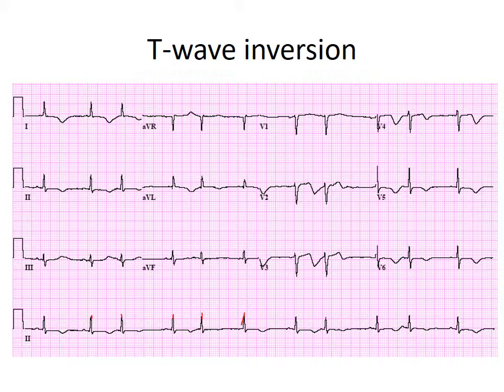All right. That being said, let's look for P waves. Do you really see P waves in here? Well, maybe at this very first QRS, on the rhythm strip at the bottom, you might have a P wave. Maybe that second one. The third one, no. The fourth one, not really. The fifth one, no. You're not getting real good defined P waves where you go, yes, I know this is a P wave followed by QRS. What doesn't have P waves and is irregular? AFib.